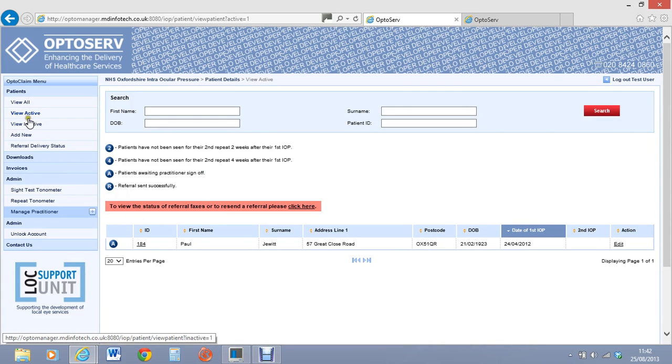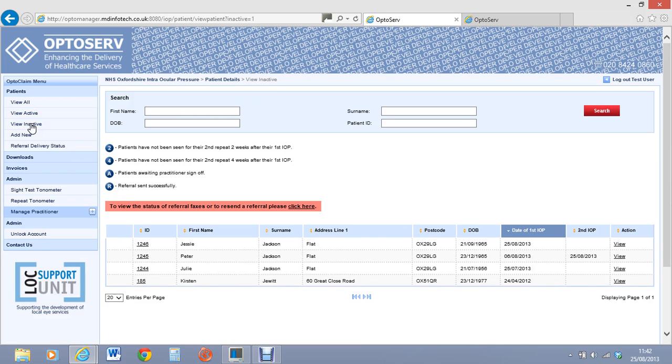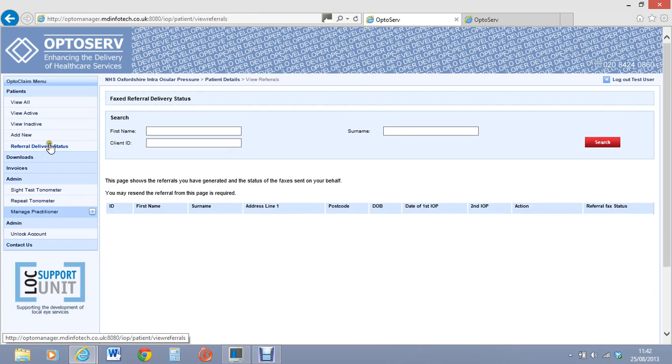Now if you go to, and I'm not sure this test site will work on this one, but view inactives. So Mrs. Jackson. Okay, I don't think it works, unfortunately, on the test site because it's not actually sending a fax out to them.